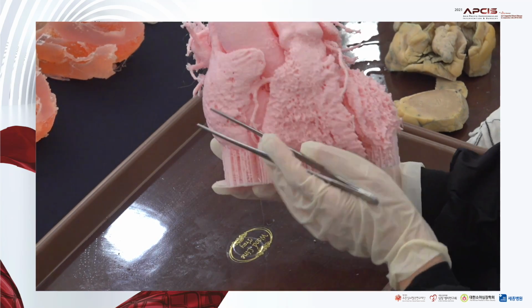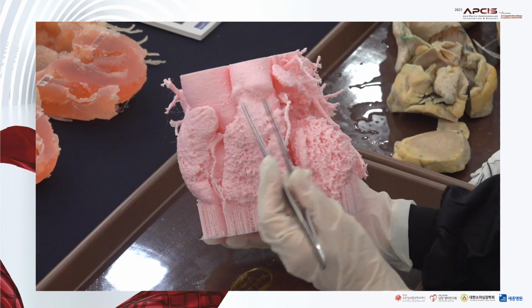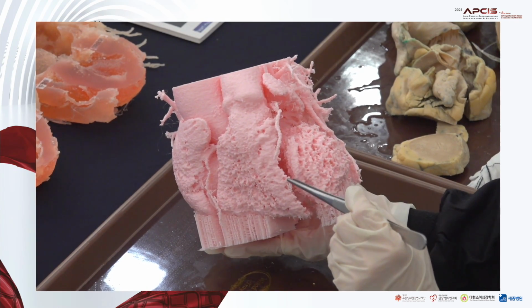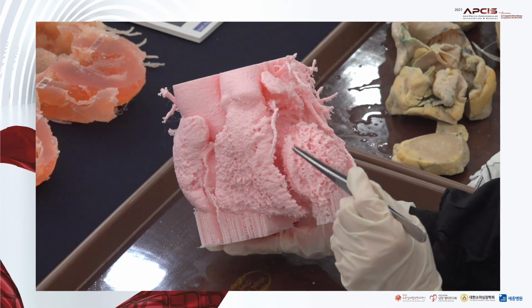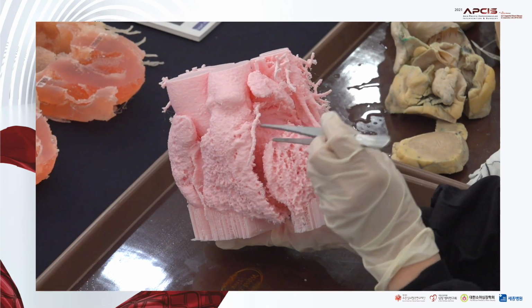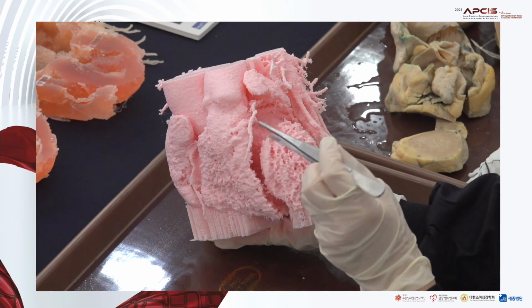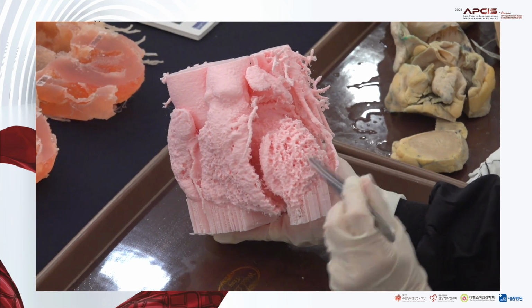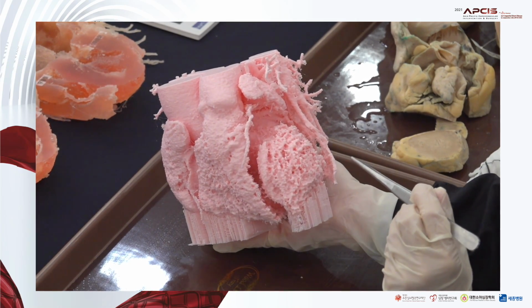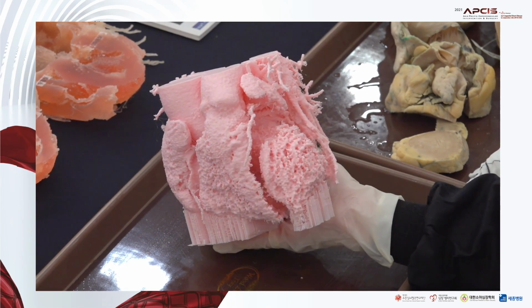So here, this is your right ventricle, left ventricle, pulmonary trunk, and this is left anterior descending coronary. So it means this part is anterior part of the left ventricular myocardial wall. So compared to the other part, it's thicker. But this is the diastolic phase, so it's relatively thick, but not that much.